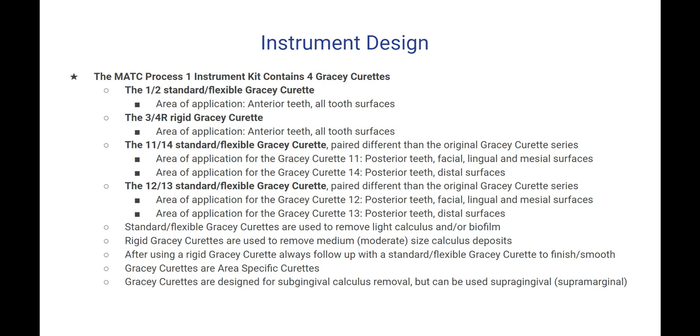Instrument design. The MATC Process 1 instrument kit contains 4 Gracey Curettes. The 1-2 standard or flexible Gracey Curette. Area of application, anterior teeth, all tooth surfaces. The 3-4R or rigid Gracey Curette. Area of application, anterior teeth, all tooth surfaces.